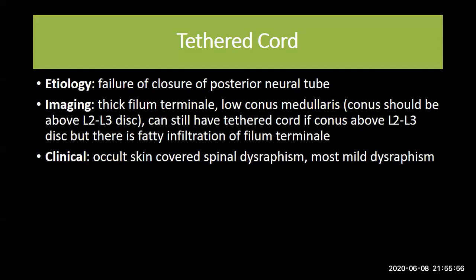Infection is what would be restricted on diffusion. It is restricted, and if there is abscess formation, it is more with abscess rather than with infection.